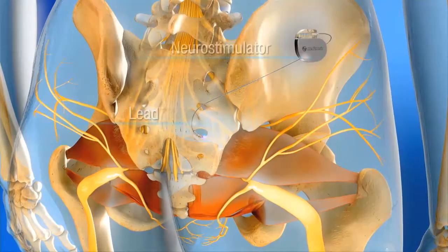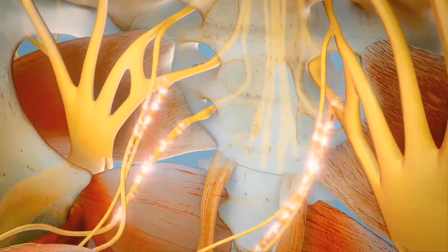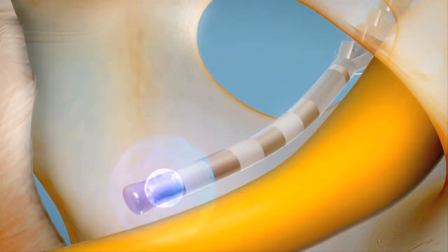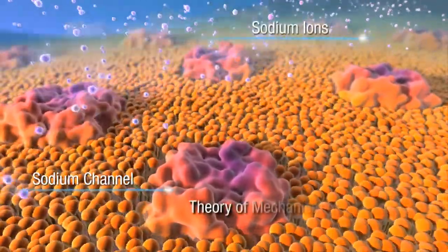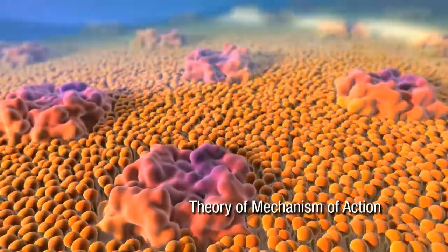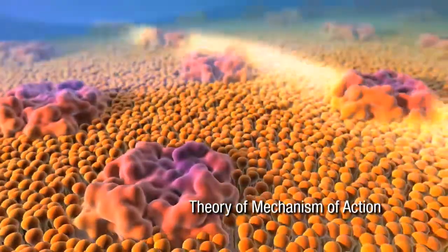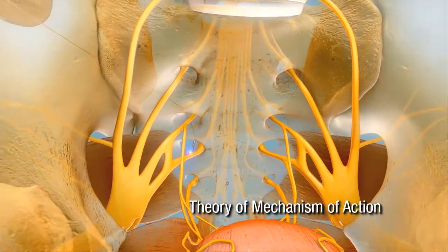Medtronic Sacral Neuromodulation delivers electrical stimulation to a sacral nerve via an implanted neurostimulator. The neurostimulator provides an electrical charge to an area near the sacral nerve, resulting in altered neural activity. This stimulation likely depolarizes the nerve, causing an action potential that propagates impulses along the axon as if the neuron naturally fired an action potential. As a result, it is thought that abnormal sensory input from the bladder is modulated.